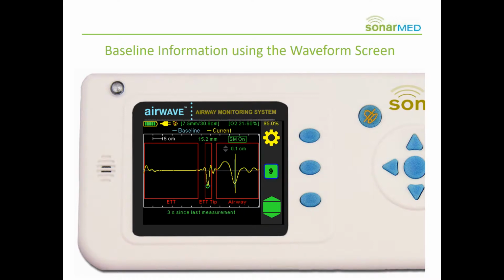This is on both screens, but here's my indicator showing my battery and how full it is. In this case, I actually have the power cord plugged in, battery's charging. This little indicator shows I have my alarm silence button on. And again, that will go on for 2 minutes and then cycle off. This tells me the size of the endotracheal tube I chose to use. In this case, it's an adult size that we're looking at, a 7.5.